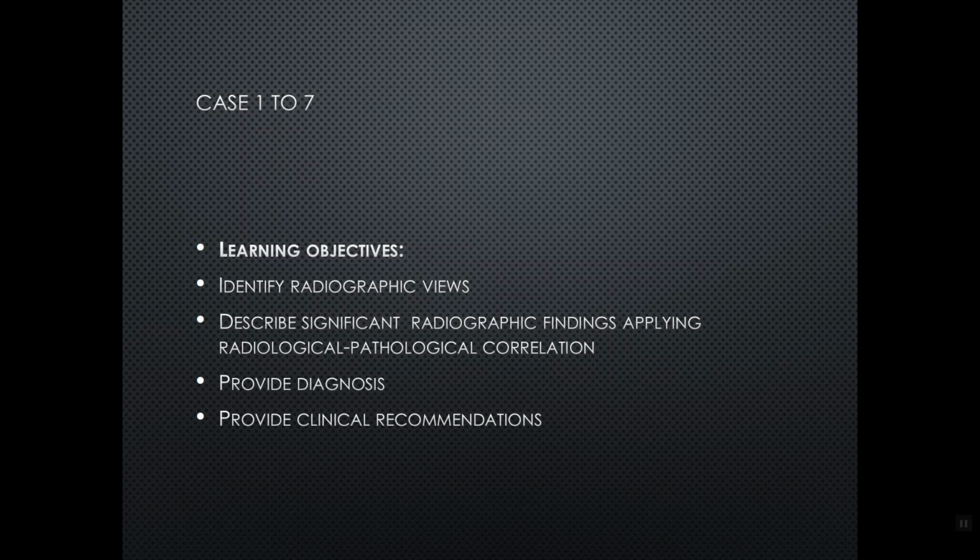Yes, hello class. In this presentation, in this lab, we are going to discuss some of the cases for this week's lab. So again, the learning objective as usual is to identify the views. Obviously, you need to recognize some important radiological-pathological correlations, and then based on those findings and correlations, you should be able to come up with a particular diagnosis and a differential diagnosis.